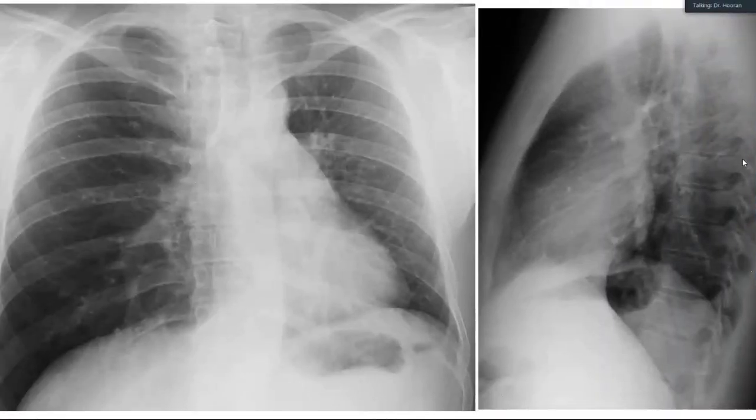I'm provided with the frontal and lateral chest radiograph of a skeletally mature patient. In the frontal chest X-ray, I can appreciate that the cardiac shadow is shifted toward the left side, and the bronchovascular markings are apparently normal on the right side. The trachea is central. I cannot appreciate the right CP angle. There is increased translucency within the right lung. The left CP angle appears to be normal. The markings in the left lung appear to be normal.